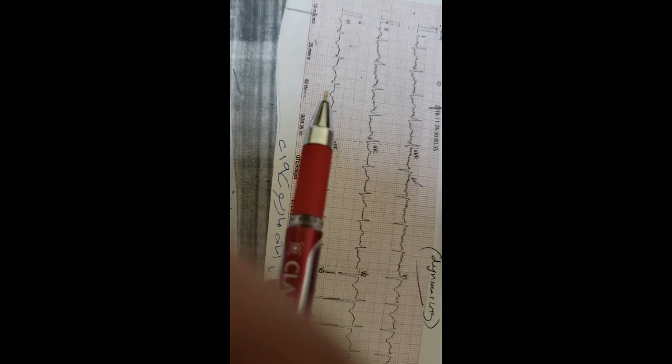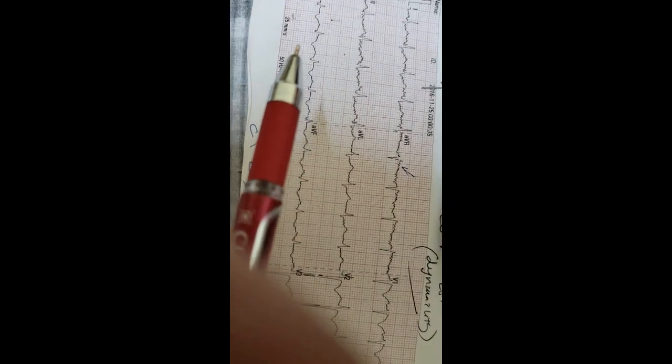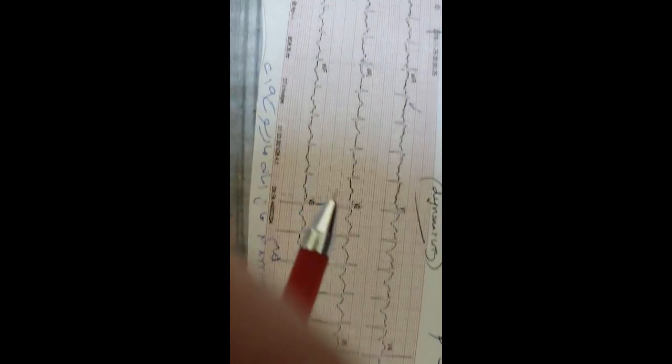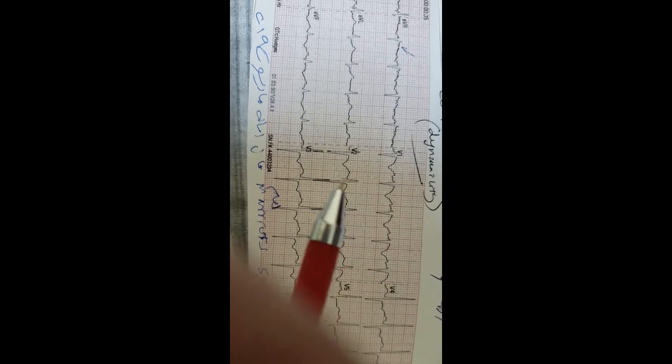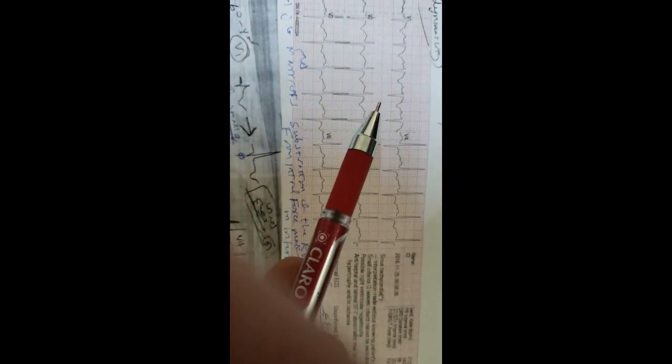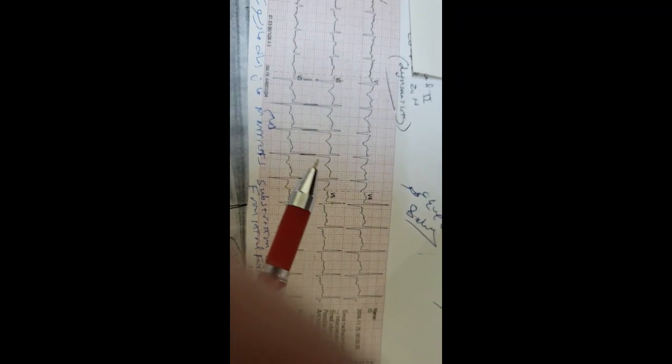The interesting thing here is that when we reviewed most of the ECGs of pulmonary embolism in the textbooks of cardiology and ECG, we found this pattern, particularly in lead 3. Look carefully: the small Q wave, ST segment elevation and T-wave inversion, with changes in V1, V2, V3, are identical in many textbooks of cardiology and ECGs.